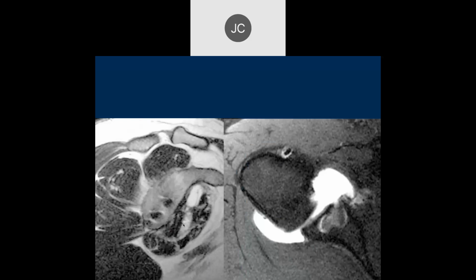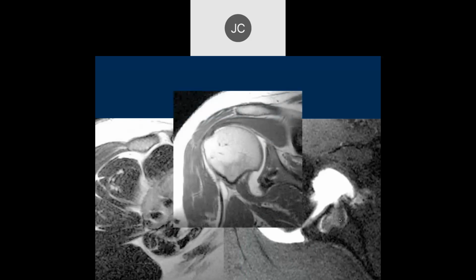And then this is an old MR study, and you can see the suture anchor placements here, anteriorly and inferiorly in this picture. These are the old suture anchors that are metal with a lot of metal artifact. Fortunately, they don't use these anymore. And there you can see the suture anchor placement of the Bankart in this old arthrogram.